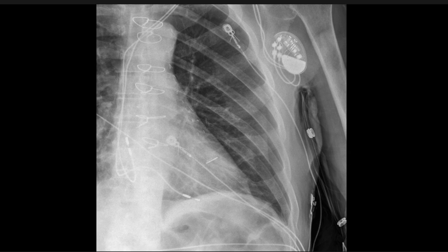Now, back to this case. Let's say that you just don't feel comfortable. Maybe you don't have enough experience, or the pretest probability for this patient is very high, and even though you're pretty sure that's a skin fold, you also don't want to miss a pneumothorax. It could get a lot worse and cause problems. So what if you're not sure? What do you do? What's the next step?